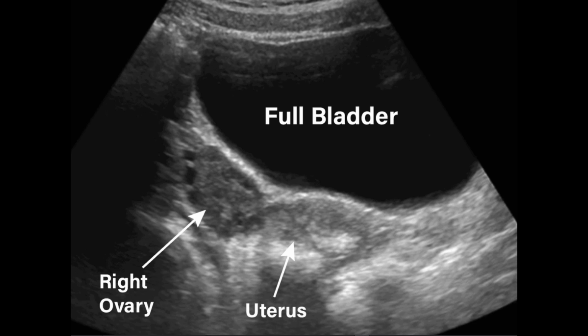Then we have the ovaries, which are like small, oval treasures, often with tiny black dots called follicles. If we see a larger black area, it's probably a cyst. If it's solid or has mixed textures, that's like finding a suspicious-looking rock in the treasure chest.